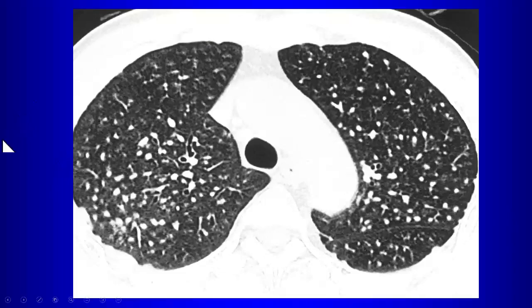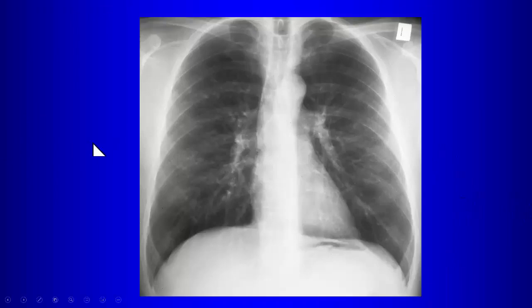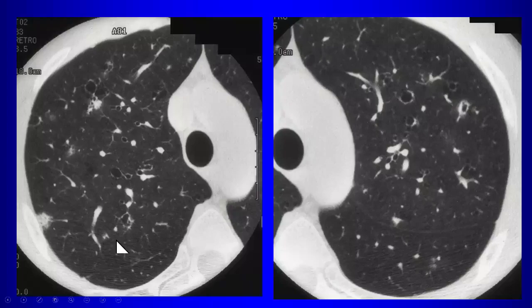So this patient does have nodules here throughout the lungs and has this finding, which is eggshell calcifications. And eggshell calcification is most closely associated with silicosis, right? So this was a case of silicosis. Here's another patient who has nodules here, more of an upper lung distribution of nodules, okay? So there they are. But the CT looks like this, and this is the disease you did not mention for upper lung distribution of nodules.